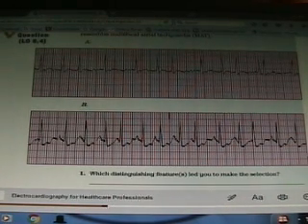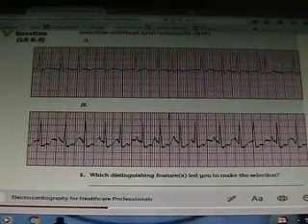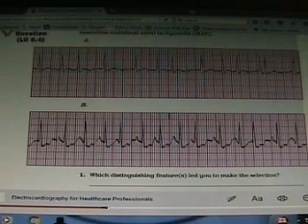But we definitely, they're both tachycardic, but now you see that the one on the bottom, letter B, the trace B, you guys can see that? I hope you can see it. Let me see. The trace here on the bottom, trace B, page 153 in your textbook, you see that all the waves are there, the P waves are messed up, and it's fast. If you look at the top, are all the waves there? I see a QRS, but what happened to the P and the T? This is craziness. And we're going to talk about that one in a moment.